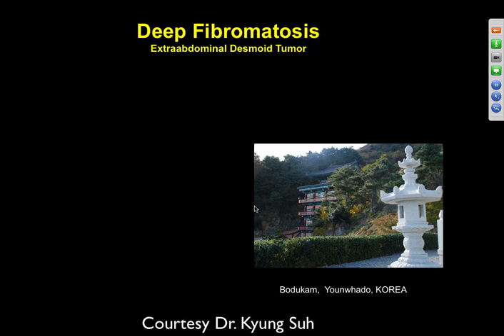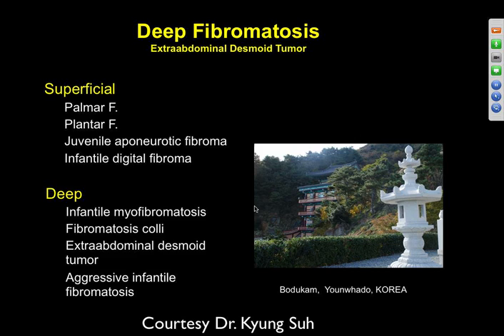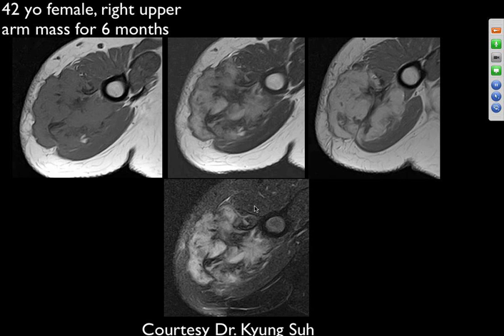Fibromatosis. Yeah, the deeper ones, especially if they're more central, tend to be more likely to be malignant.